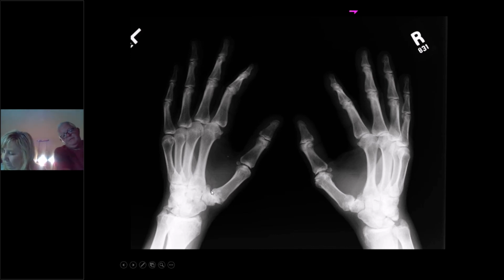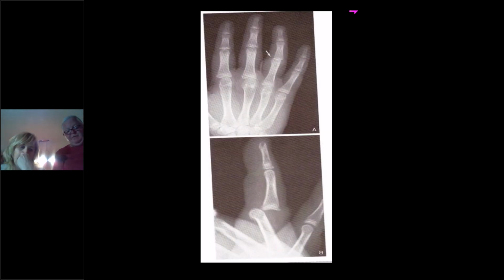And this is just a typical wear and tear, overuse type scenario. This is the kind of thing we see because obviously we're not simians. We use thumbs, we oppose, and obviously that can lead to premature arthritis. Remember what I said before, one view, no view kind of thing. If we look at the x-ray on the top, not too many people would be real excited by that x-ray.